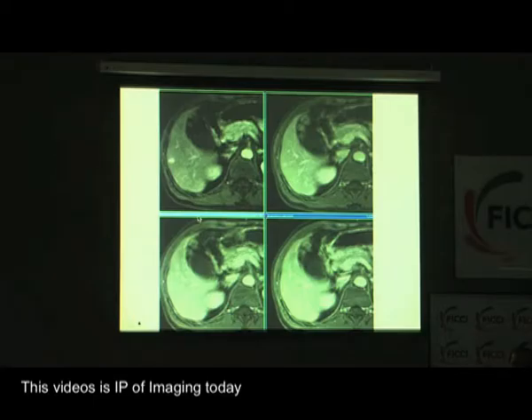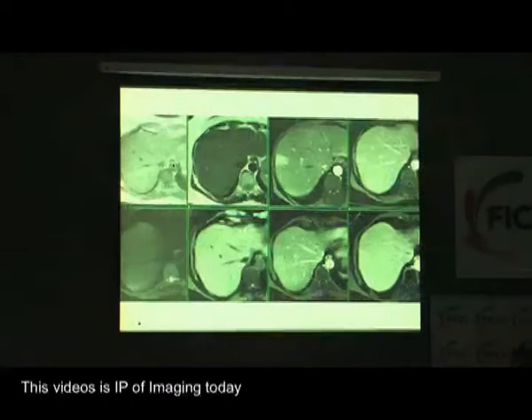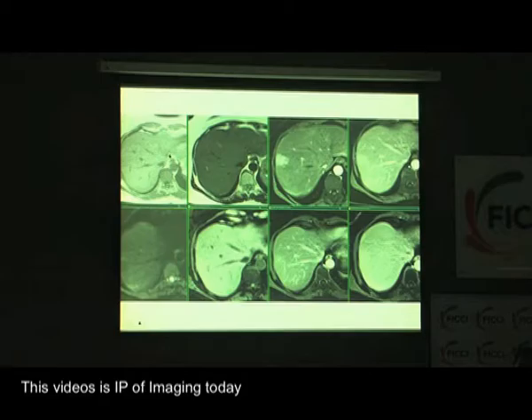And when we are looking at vascular lesions, they tend to be hypervascular because they're malformations, and like all other benign lesions, they either tend to remain hypervascular or hyperdense or hyperintense and do not show washout. So here is a small AV malformation here. Here's another patient who has a normal looking liver. On the plain scan, there is no focal lesion, but on the arterial phase, you can see that there is a focal area of enhancement, and it fades like all benign lesions do on the portal venous and hepatic vein phase.